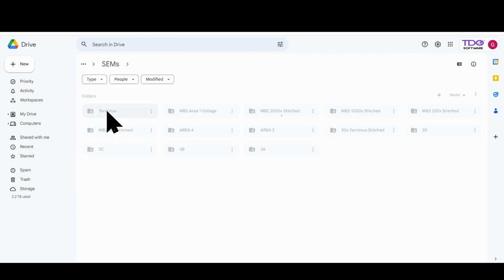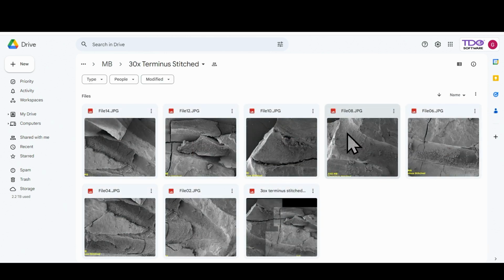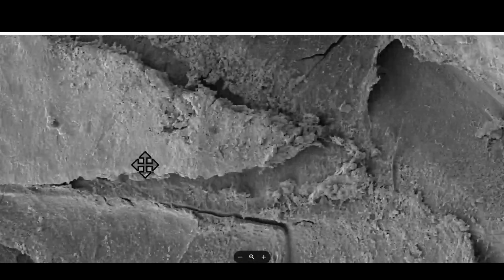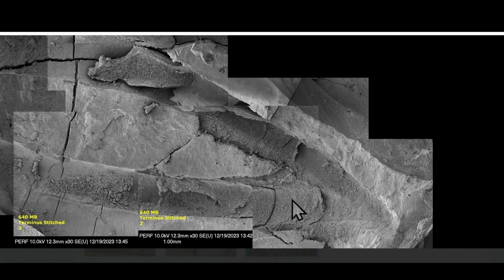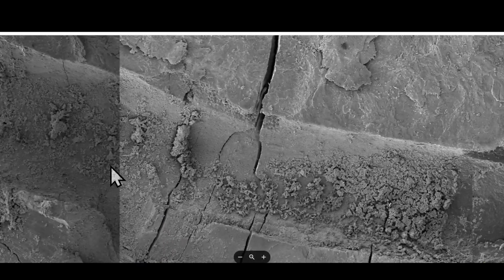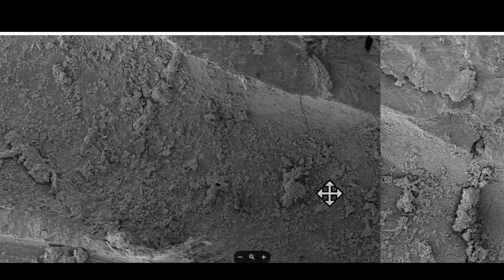And when you go into the stitched image on the MIE site, let's go ahead and look at the lower power stitched images first. It's very difficult to stitch these images when I cannot make the canals perfectly parallel to each other. So I'd like you to spend some time, look at what the soft tissue looks like after it's been dehydrated, get a sense for what that looks like, and then take a look at the debris on the canal wall.